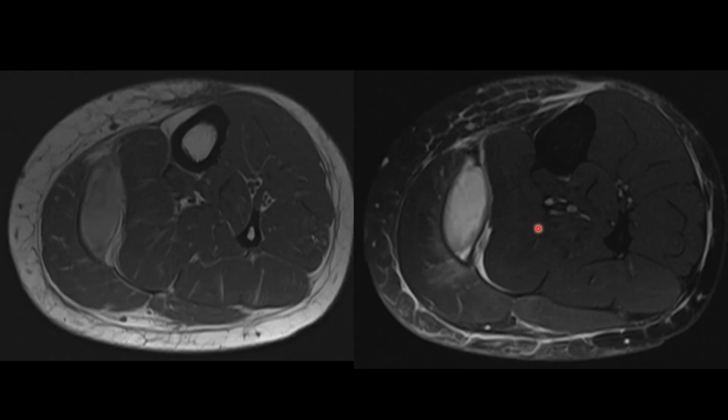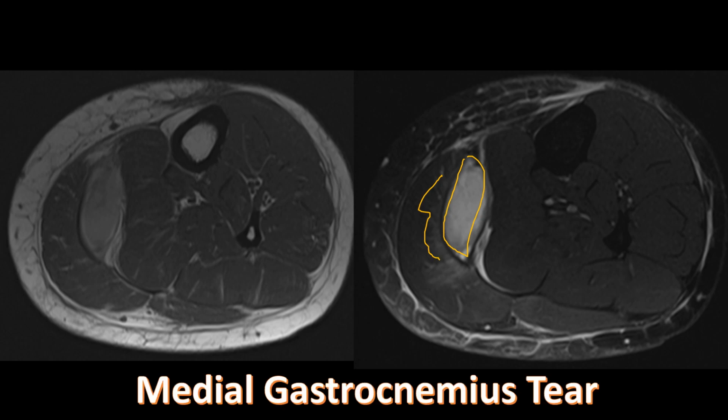In the MRI T1 and T2 signal intensity, we see this fluid collection, which is actually blood because it shows high T1 signal intensity with methemoglobin. And we can see that it's actually within the gastrocnemius muscle, and some of the blood is extending between the soleus and the medial head of the gastrocnemius, but most of it is within the muscle here. And there is some edema around the muscle, so this is a medial gastrocnemius tear, which is the most common thing we see when we hear a pop in the leg of a patient.